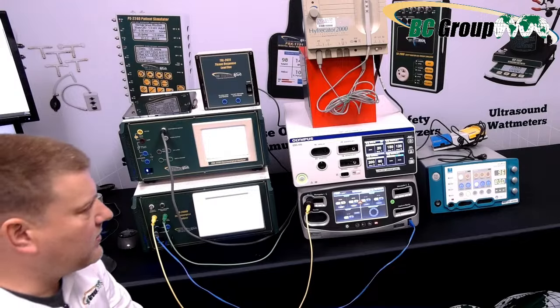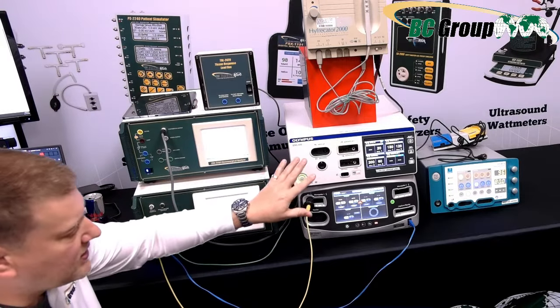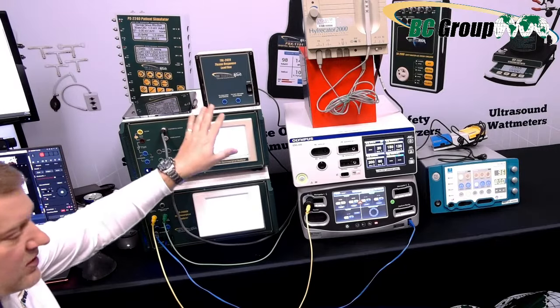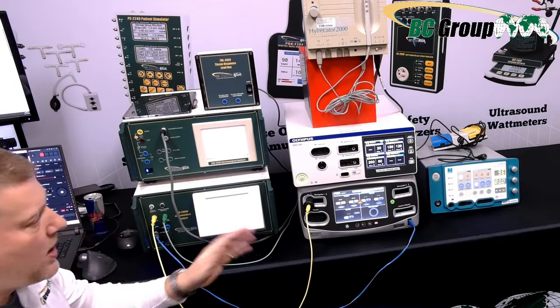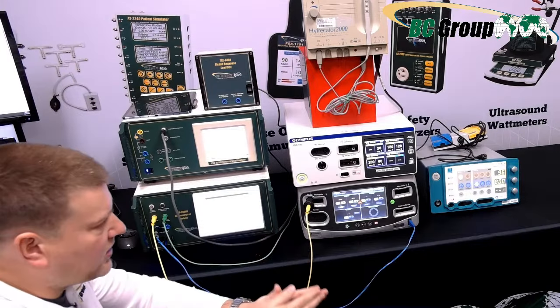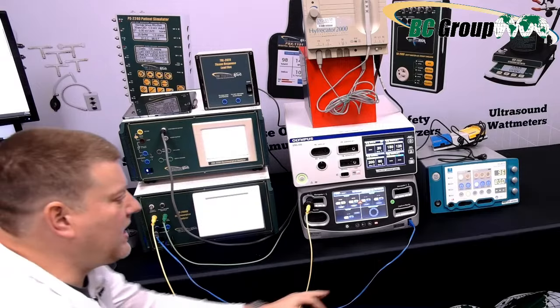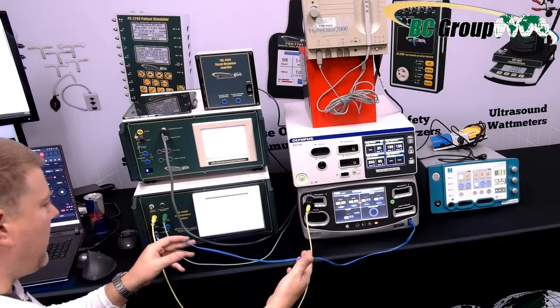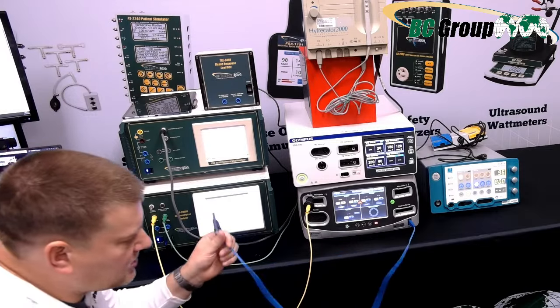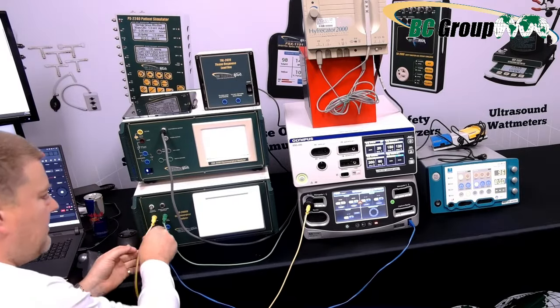So let's first talk about what monopolar is, because you have to understand what these types of functions are in order for you to select the correct menus over here on the ESU analyzers. So monopolar, it's going to send out energy on one of these ports, and it's looking to return that energy right here on this probe. And this is sometimes called a dispersive electrode. It's called a bunch of things for different manufacturers.